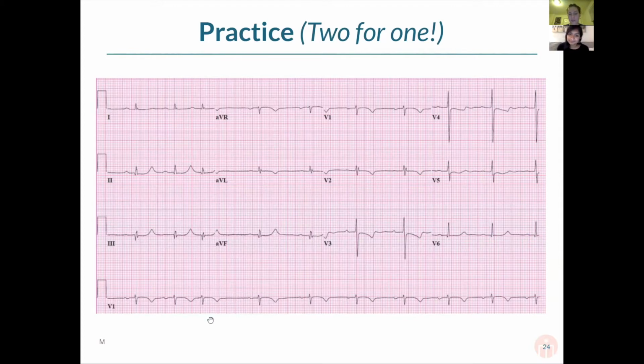This makes this EKG a little trickier. If you look at all the other leads, it's not an issue, but this one little part here, there's this QRS that's like, what's happening? It comes a little bit early. I think this is just a premature beat. You can also get a sinus arrhythmia that looks like this, especially in younger people with breathing pattern variations. In those cases, there's still a very classic P before every QRS. This may be a PAC because I don't even see a super clear P before it, which is a little tricky and, again, kind of outside the scope of this. But if you ignore this, all the rest of them have a very clear P before the QRS. It's not a Mobitz type pattern because there's no dropped beats really.